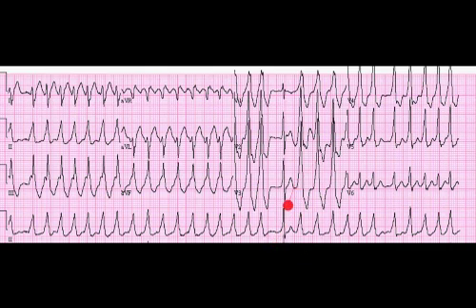So this would be the strange combination of an abnormally wide QRS in the presence of atrial fibrillation, with additionally PVCs in threesomes occurring right in the middle of the tracing. It's not a very satisfactory solution, but that's all I'm doing for the present.